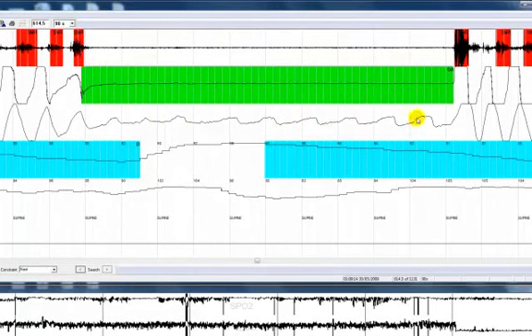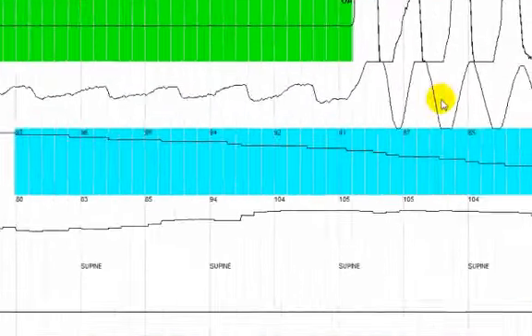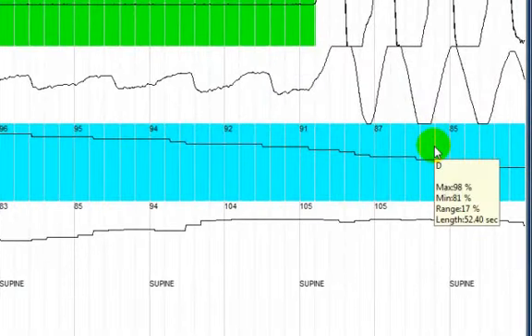At the same time, as mentioned earlier, we see the continued respiratory or ventilatory effort, and this defines a textbook obstructive sleep apnea. Both prior and following the apneic event, we see recovery breathing, and of course an arterial oxygen desaturation from 98% to 81%, or in other words, a desaturation of 17%. This desaturation event lasts 52.4 seconds. Desaturations typically lag a respiratory event by 15 to 20 seconds when using a finger probe.